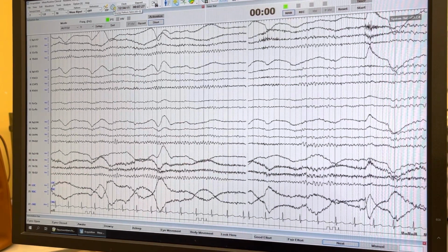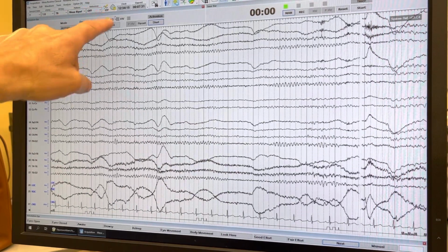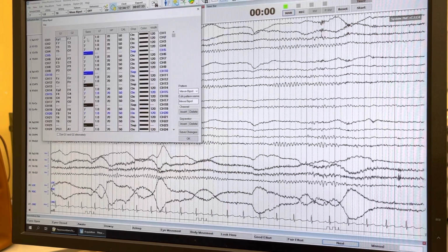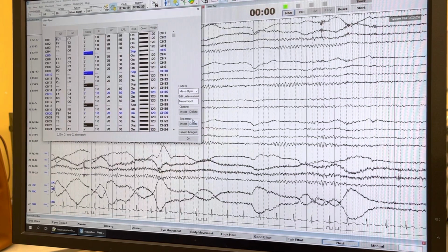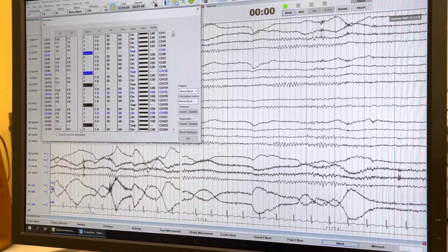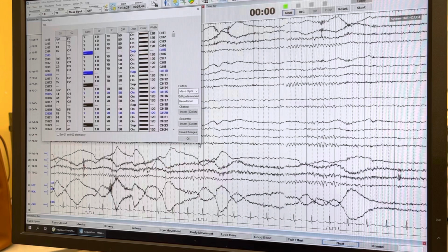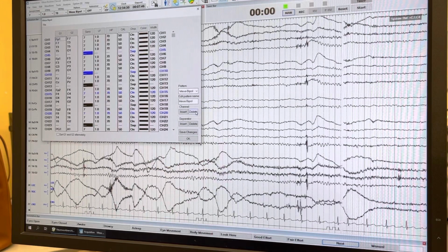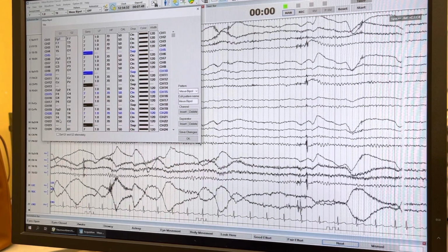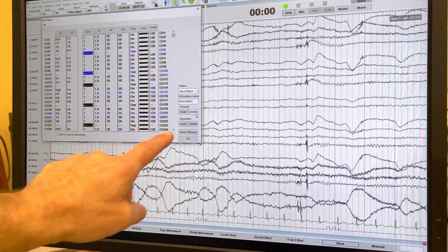This one right here will display your montage. You can actually add channels here if you want, or take channels out. So here's a channel. It says insert or delete. If you click on a channel right here, you can delete it right here.